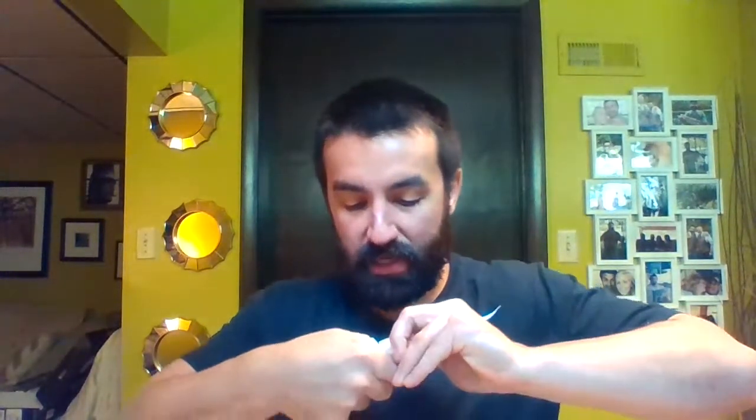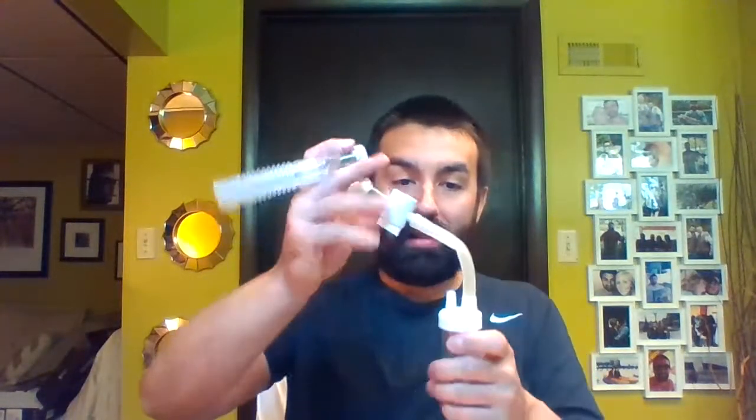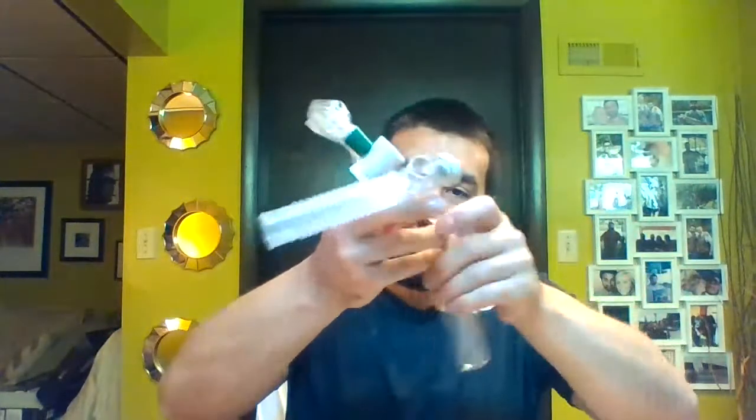Okay, I believe that concludes everything we need to talk about. Oh, one more thing here. The Luken's trap specimen trap. I showed you, if you're going to go ahead and get a sputum sample, make sure you got a clean suction catheter or a new suction catheter. You don't want something they've been on for a long period of time, okay? That hooks on right like that. Your suction tubing hooks on, and you can go down your airway. As you suction, it's going to drop down and in here. If you get stuff hung up in your tubing, you can use this little lavage port, draw some saline through, and suck that stuff down and in.